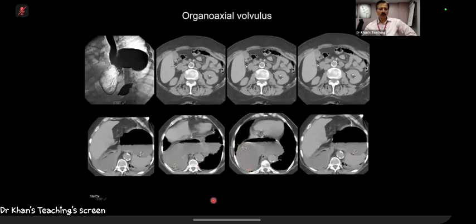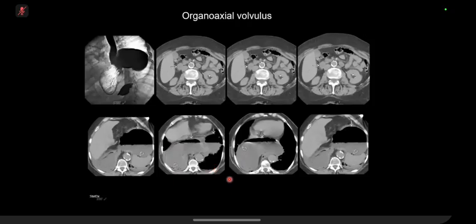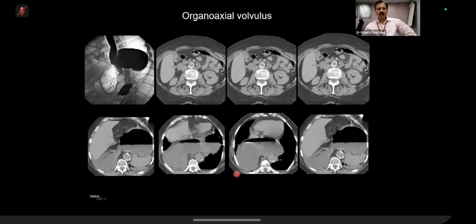And candidate 4, what does it mean? What is happening? There's air in the wall, so impending rupture or perforation, pneumatosis intestinalis. Right. So this means that the volvulus has strangulated and there is ischemia. So there must be a twist of more than 180 degrees. And now it is impending perforation, or there might be a bit of perforation because there are some bubbles which are sitting outside.